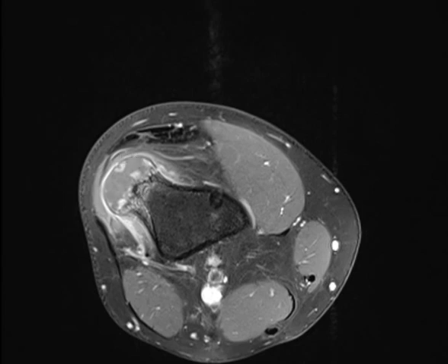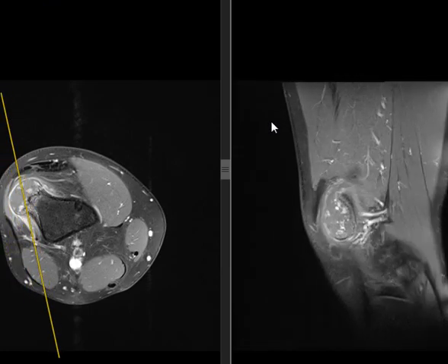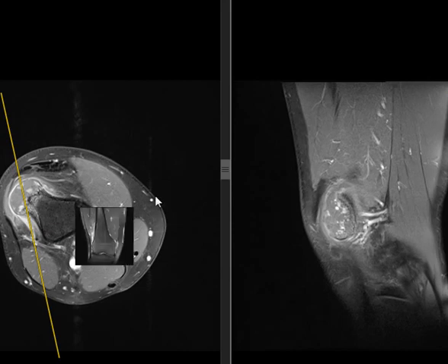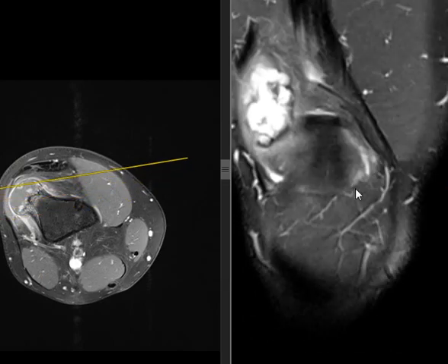Okay, just a second, let's see it here. Look at the areas of enhancement. I don't think we have. My technician didn't do a pre-contrast image for it. But anyway, you can see easily that this is hyperintense.